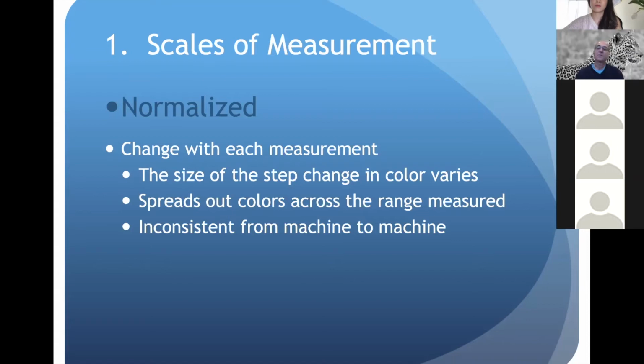A 42 isn't always green, and I think that leads to difficulties with comparison, particularly if you're trying to compare maps that have been performed, say, on an ISIS, and then trying to compare that to a Zeiss topographer, or trying to compare that to an OPD scan. As it is, it's extremely difficult, I find, to compare maps.